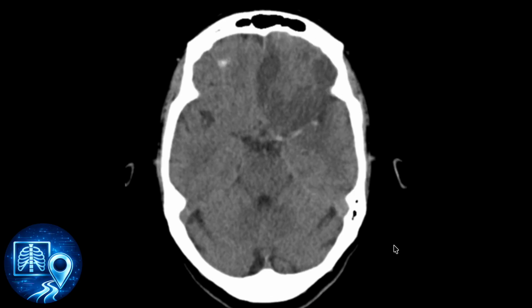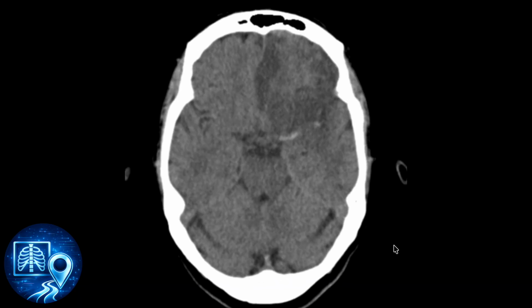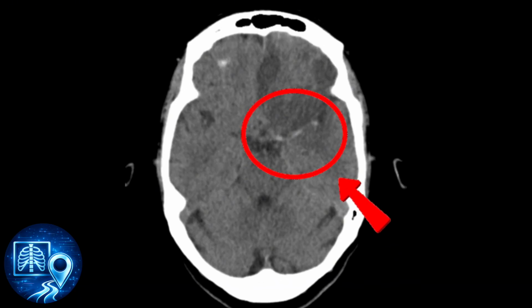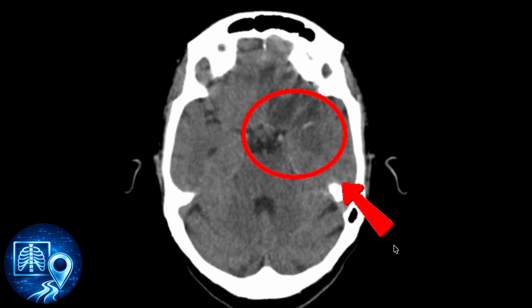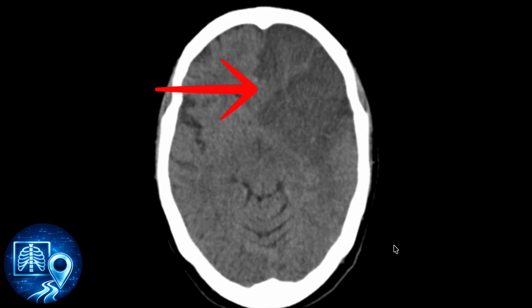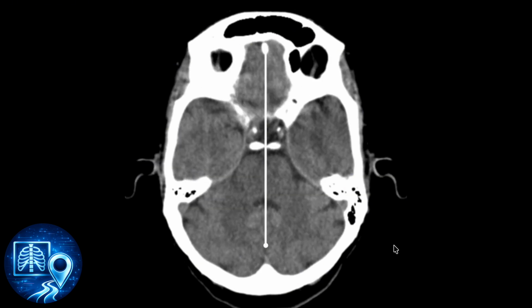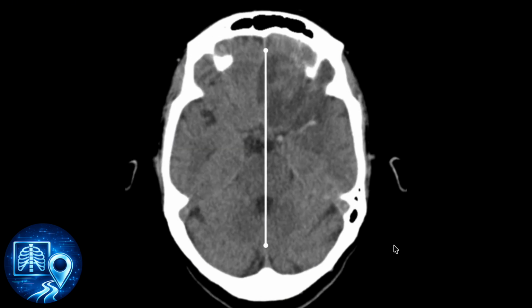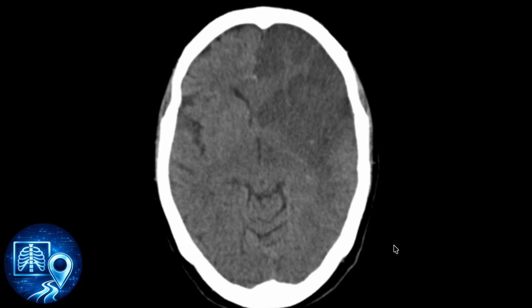On non-contrast CT, one middle cerebral artery appears hyperdense compared to the other side. This represents acute thromboembolic occlusion. In this case, there is also a large hypodense area in the MCA territory with loss of gray-white differentiation and mass effect with midline shift. Recognizing this early can identify a large vessel stroke requiring urgent intervention.